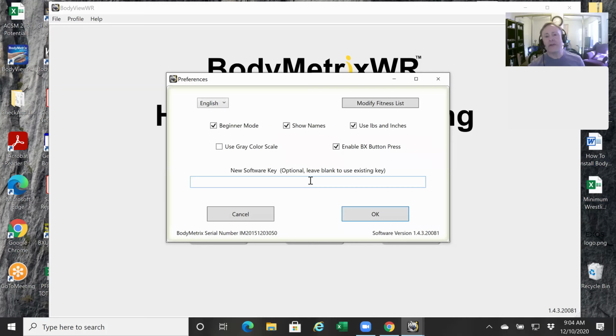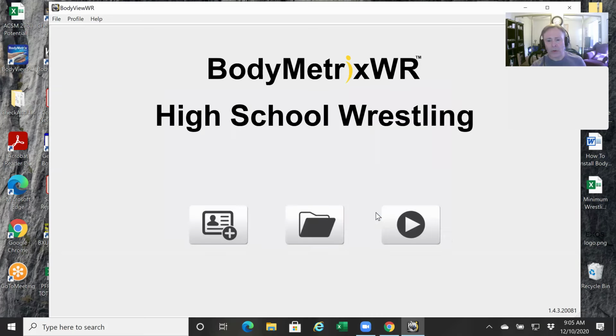I just need you to make sure that you have a check mark both in the Show Names box here. Probably looks like that. You just click inside that box. And also this Enable BX button press box, okay? And once those are checked, we'll click OK and we're good to go.